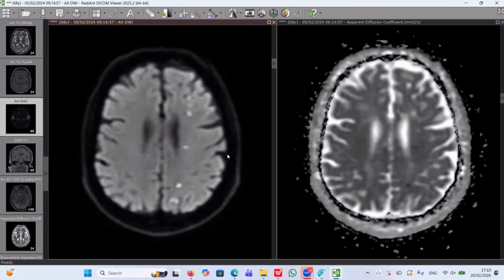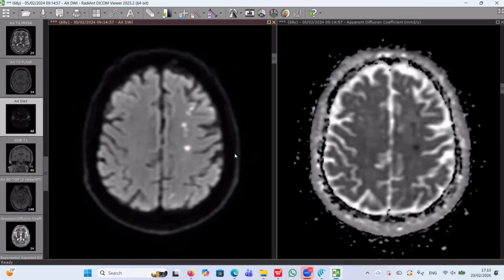Sir, mainly when these are at the junctions of the two territories. Okay, we should have three or more lesions, and at least one of these three should exceed 3 millimeters in dimension. And also they should be in a linear fashion, as you can see here.